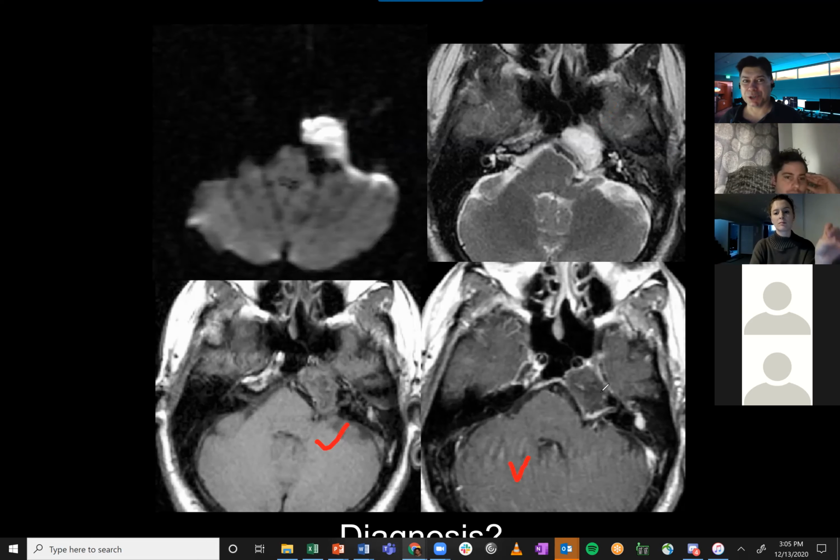Now, where this gets tricky is a lot of people like to have the discussion about, well, what if this patient showed up with deep face pain behind the eyeball, his sixth nerve is out, and he's got otorrhea, infected fluid coming out of his ear? I guess you have to consider, could this be an abscess or an infection kind of process?